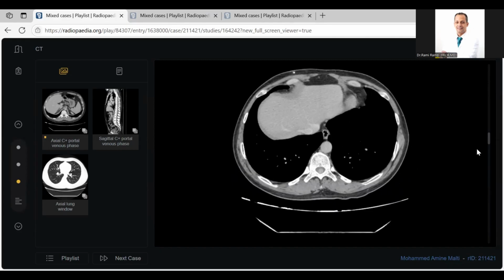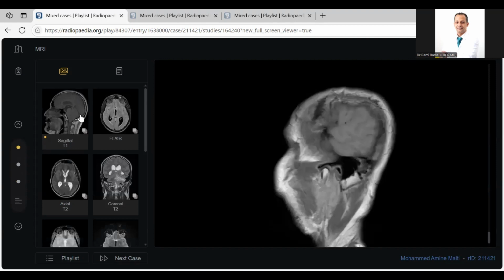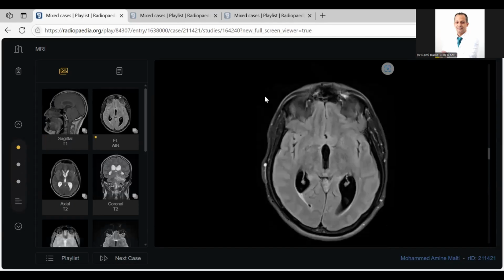Sir, I can see in the spinal canal some hyperdense area, which needs to be further investigated for a spinal hemangioblastoma. More than excellent. Really, you impressed me so much. We did this brain.